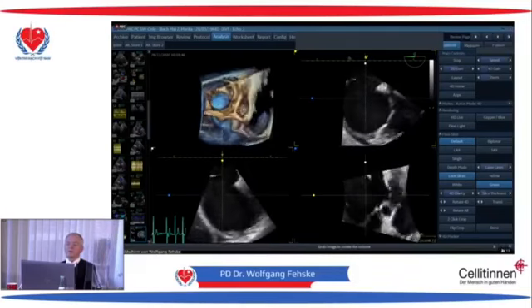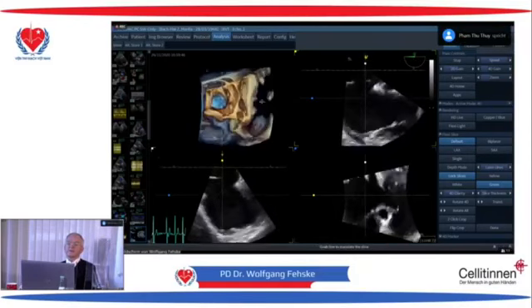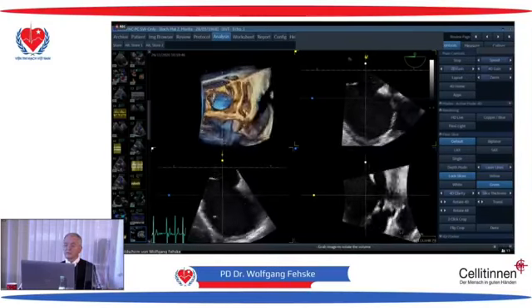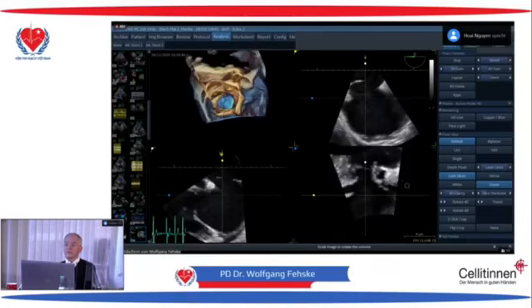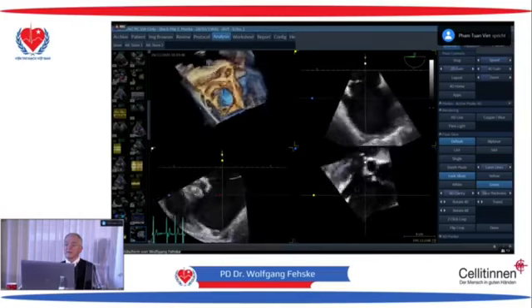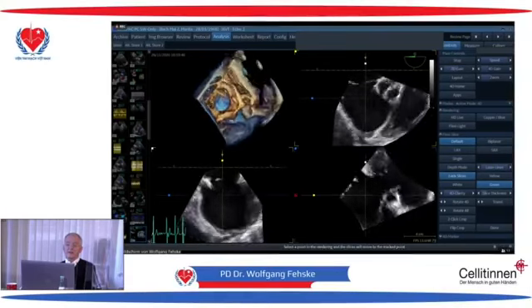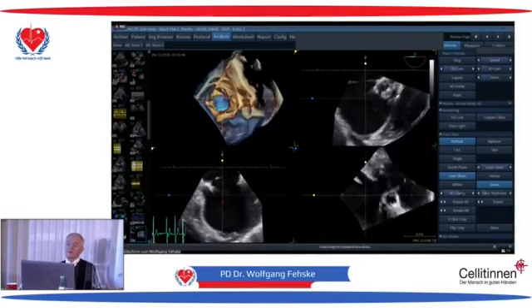Operationally, because I'm with the surgeon. About rims, we need the aortic rim. The problem in these patients is that if we want to do it with the occluder, we must have enough rim. I think the superior vena cava rim is very soft. Very soft. And what we see in addition to that is that it is fenestrated here. So it is really a critical case.